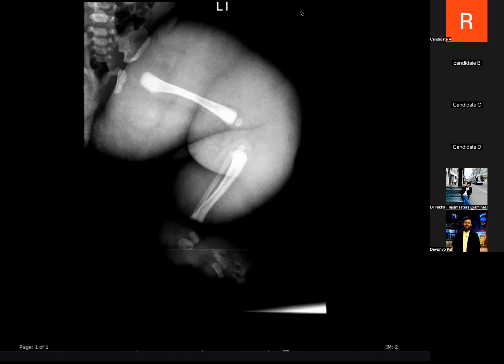Thank you. So what are your differentials at this point when you see something like this? So this could be a vascular malformation, a soft tissue vascular malformation, such as lymphatic. Other possibilities could be a lymphatic malformation, and also a limb hypertrophy, a syndromic hypertrophy, which could be due to Beckwith-Wiedemann syndrome or Klippel-Trenaunay syndrome, like that. Right. So what would you like to do next?